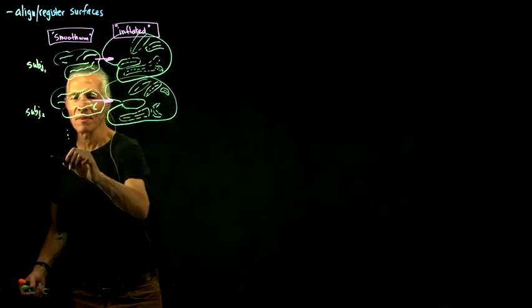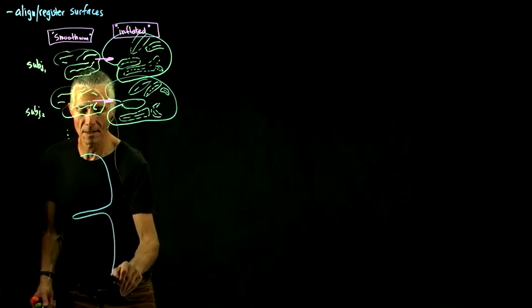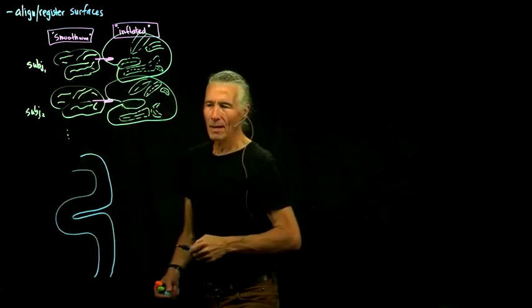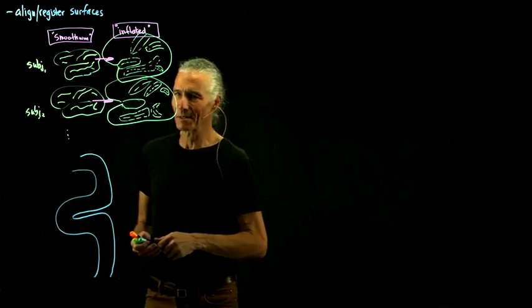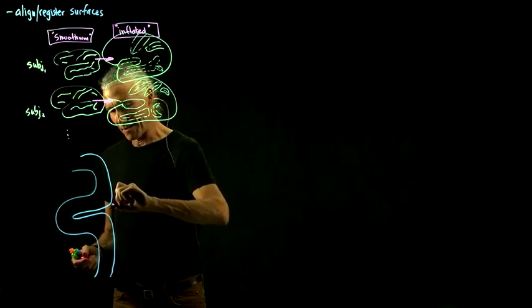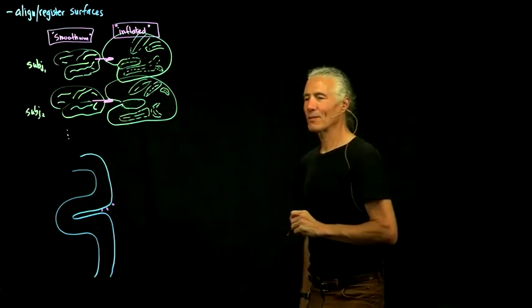So let's look at a sulcus here. So here's a sulcus, like that. There's the gray matter. Now, where is the sulcus? That's a good question. Is it right where it turns in, or is it sort of down here, or is it until you get over here? It's not totally straightforward to define it.